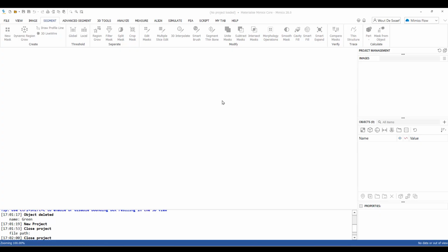Hello everyone. In this video, I will give a brief introduction to Mimics Core and how to get started with the software. To do that, I will cover how to import DICOM images, I will go over the software interface, and I will show how to navigate those images.